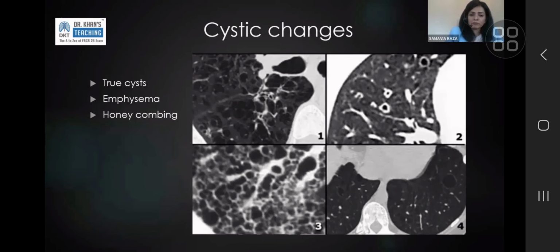When you look at number 1, and if the question is, does the patient have cystic lung disease, you have to look a bit more closely, and you have to look for the signs that can help you differentiate between emphysema and cystic lung disease. So in cystic lung disease, you are saying that the cysts are within the lung parenchyma. In emphysema, what looks like a cyst or a space is actually destruction of the airspace. So emphysematous spaces do not have walls. What they do have is remnants of structures that used to be normal lung stranding through them.